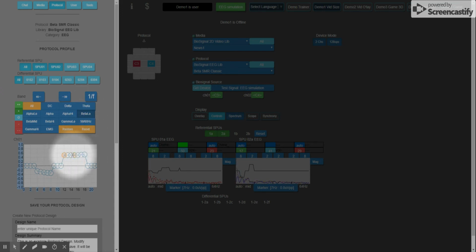That says that there's a multiplying factor here, that if it's full strength, all the energy in that particular bin is carried forward to be considered whether a reward or inhibit is generated. If it's less than that, we can set any arbitrary value that we're saying that this frequency here, this bin here, has less influence than the one next to it in terms of generating rewards or inhibits. That's the principle. There's a multiplying factor there.